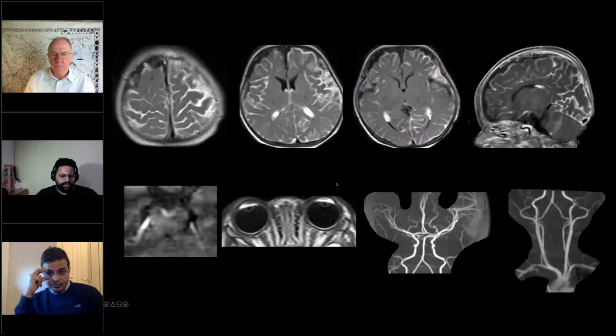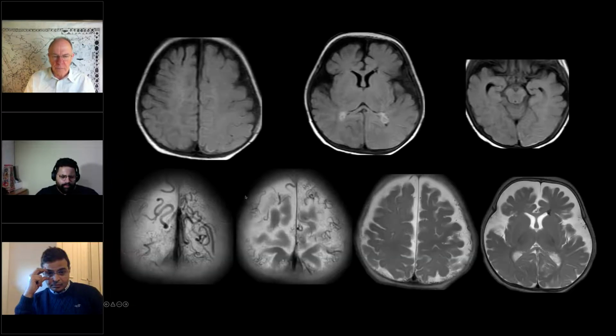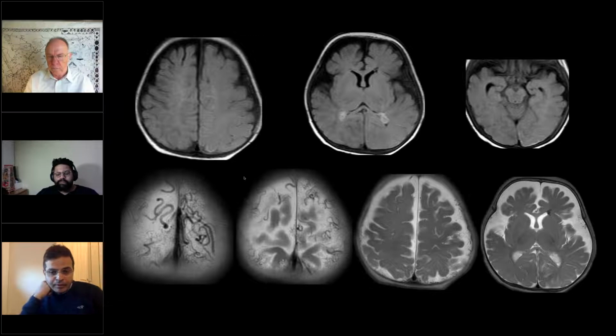The only question was, I was not able to find any. I mean, are these cortical tortuosities common or not in Sturge-Weber syndrome? The rest of the imaging findings are possibly typically present, but the question was of the tortuosity of the vessels. Extremely common, Nihal, and grossly underreported.